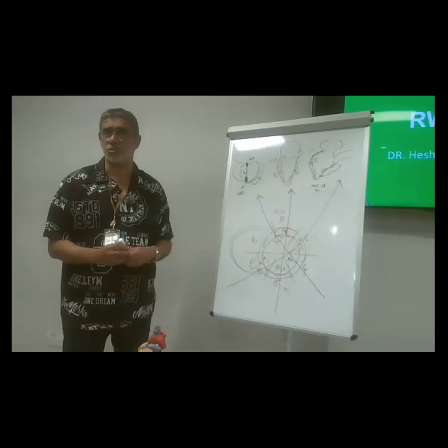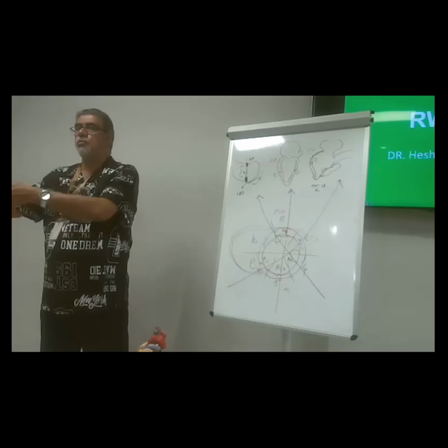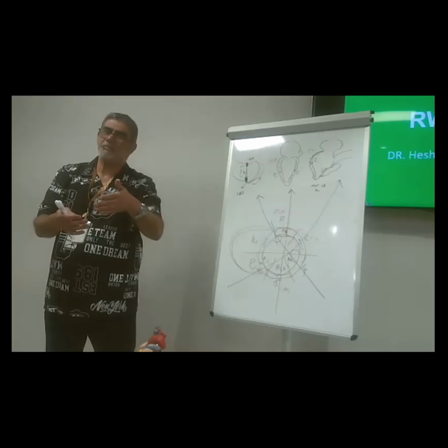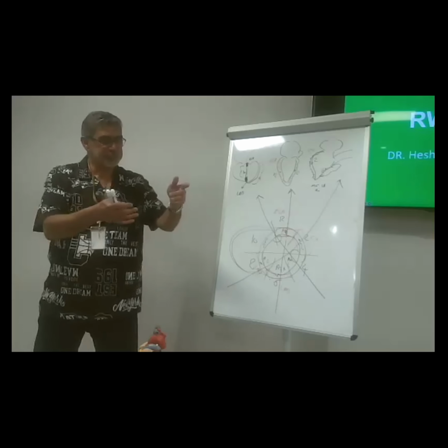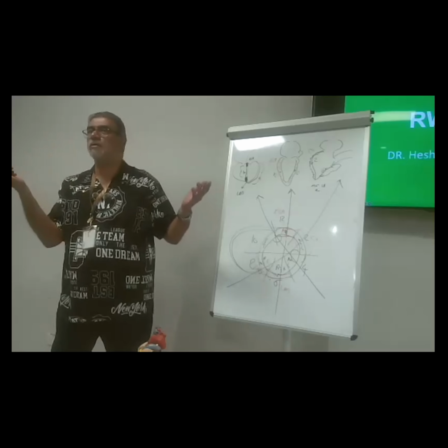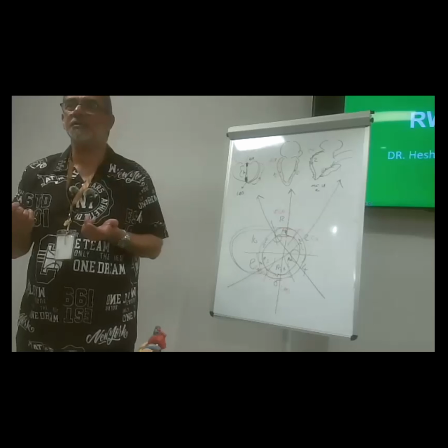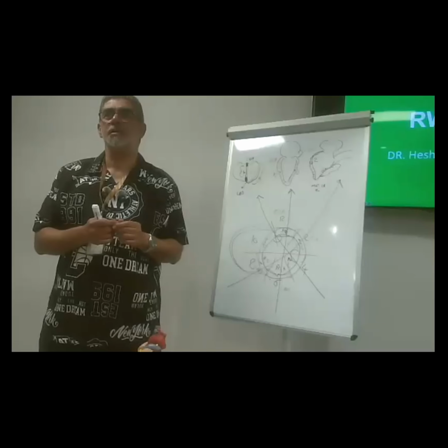Now, what about motion? It's very simple. Either normal motion, hypokinesia, no motion, akinesia. Be aware of me, I'm aggressive. And dyskinesia, which is paradoxical movement. What? He said paradoxical. Yes.